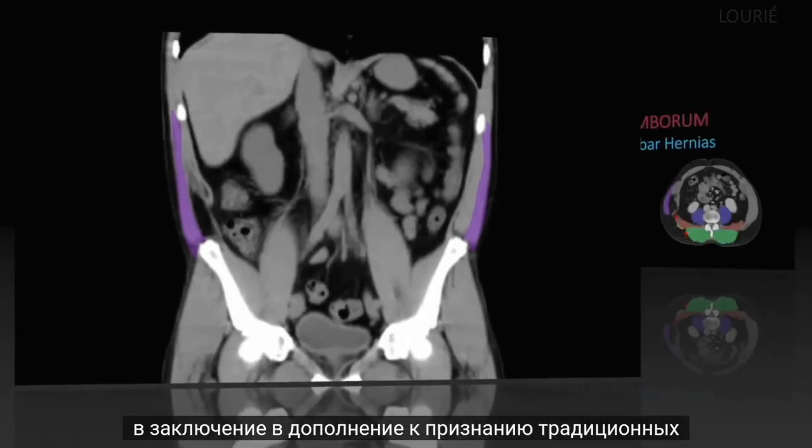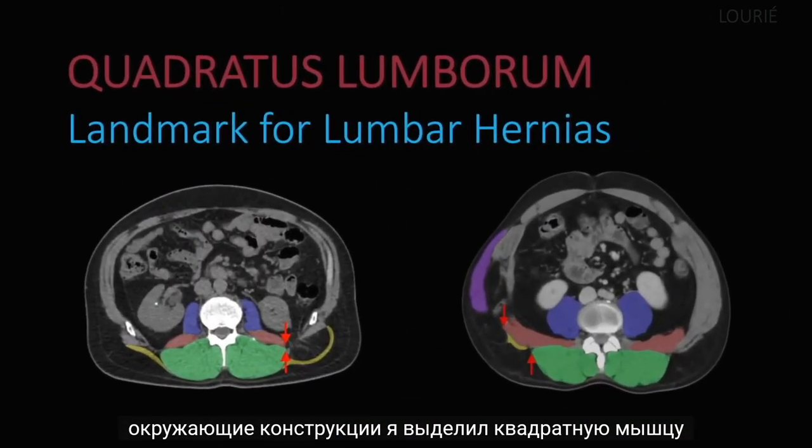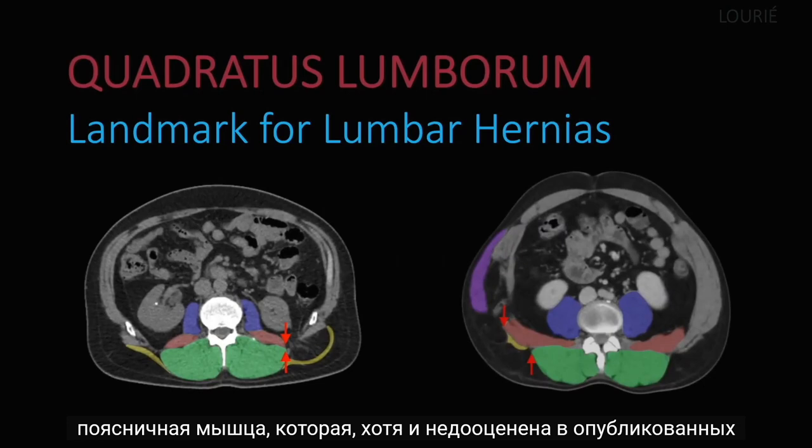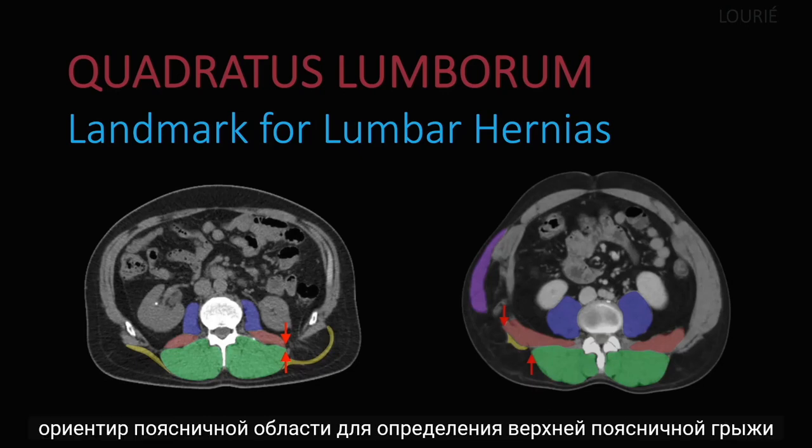In conclusion, in addition to recognizing the traditional surrounding structures, I have emphasized the quadratus lumborum muscle, which is, though underappreciated in the published literature, in my belief, the key, reliable, orienting landmark of the lumbar region.